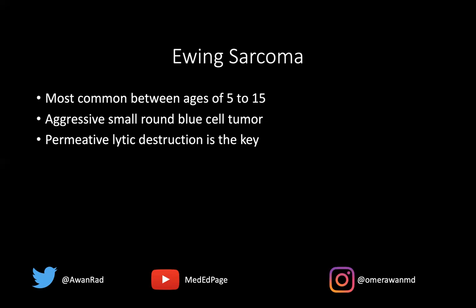This is an aggressive small round blue cell tumor. The permeative lytic destruction is the key to the diagnosis.